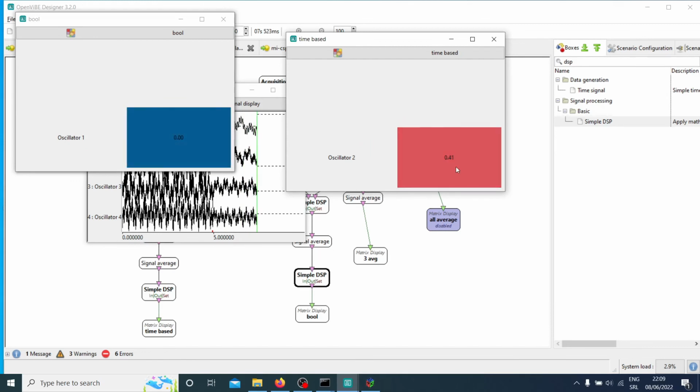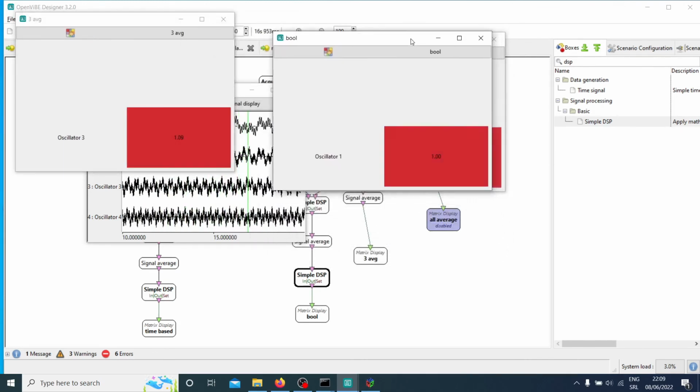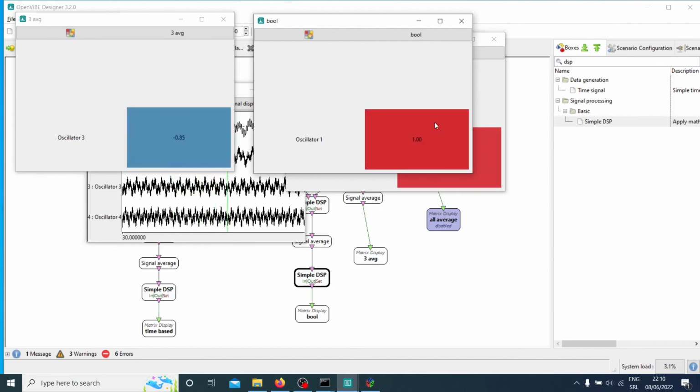Okay, you see, here you have this power value, which again is not really fluctuating too much. What I want here, so it's 0 or 1, 0 or 1, 0 or 1. See? So if you want a true or false, 0 or 1, all or nothing kind of response, or want to control something between 0 or 1, on or off, this is useful to know.